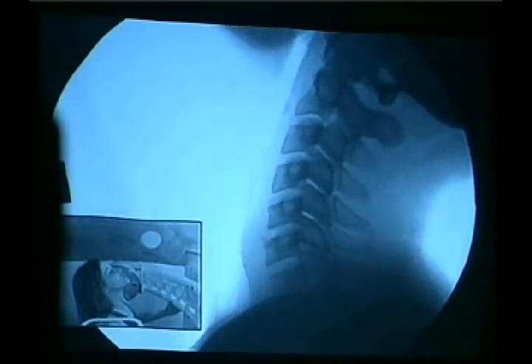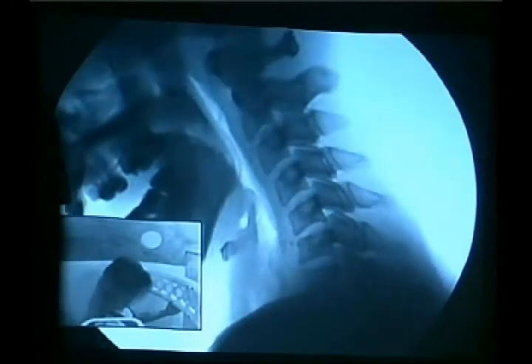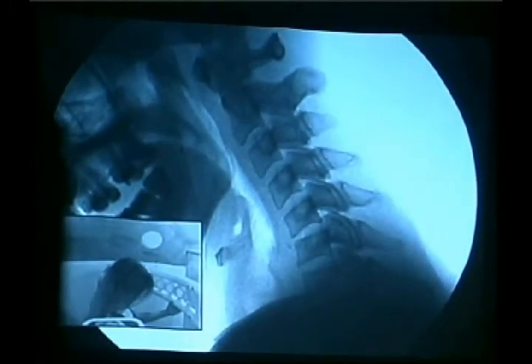So what we do is we can see Susie. Her complaint was stabbing pain when she looks up towards the ceiling. And if you follow this George's line up, right there, bam, it comes back. That's a shift shearing backwards, tearing of the anterior longitudinal ligament. We freeze it, we add arrows, we send the tape into the insurance company, and right there is actually that disc angulation. I mean, right there, the disc is pinching in the front, right there, and it's gapping in the back.